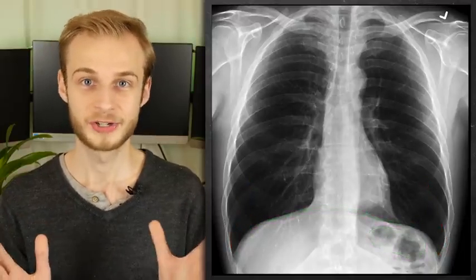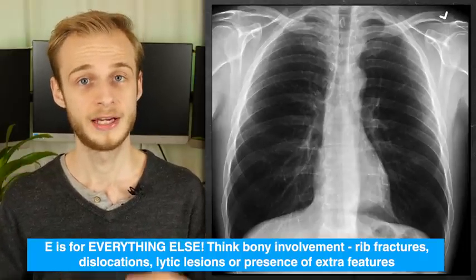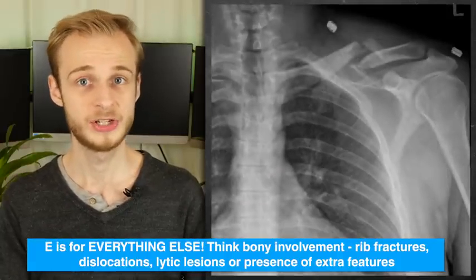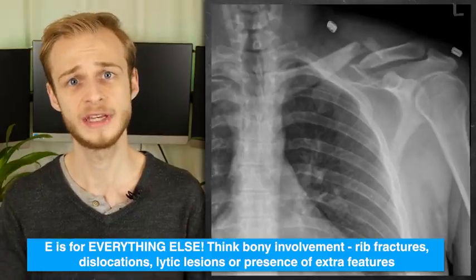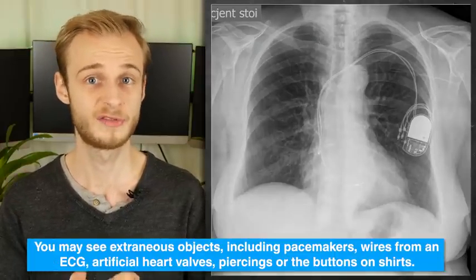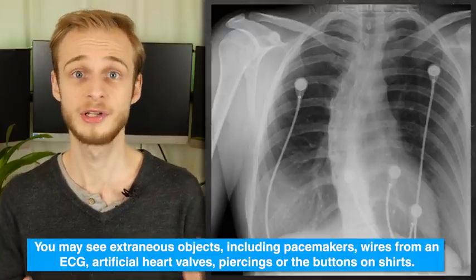Now E is the catch-all one. E is for everything else. The main things that you're looking for here are damage to bony structures, such as rib fractures, dislocations of the long bones, lytic lesions, obvious soft tissue damage, or the presence of any extra features that might concern you. Some other completely circumstantial things you might see on a chest x-ray include the wires from a pacemaker, ECG leads, as well as potentially artificial heart valves.